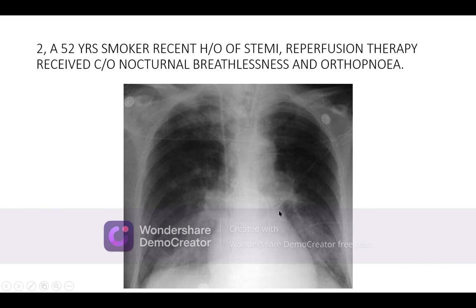On the basis of this finding, the lung fields can be described. The apices, first intercostal space, second, third, fourth, downgoing, and then you see the perihilar shadows here. There are some patchy opacities visible. Probably he has received therapy. He was on therapy, so there is a resolving type of homogeneous or non-homogeneous opacity. The air bronchogram pattern is seen here bilaterally.